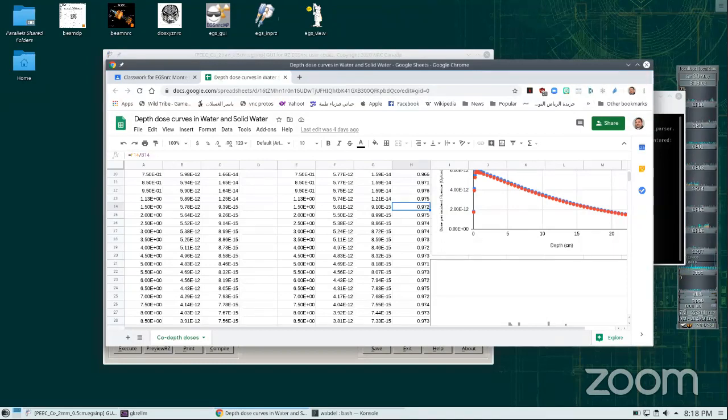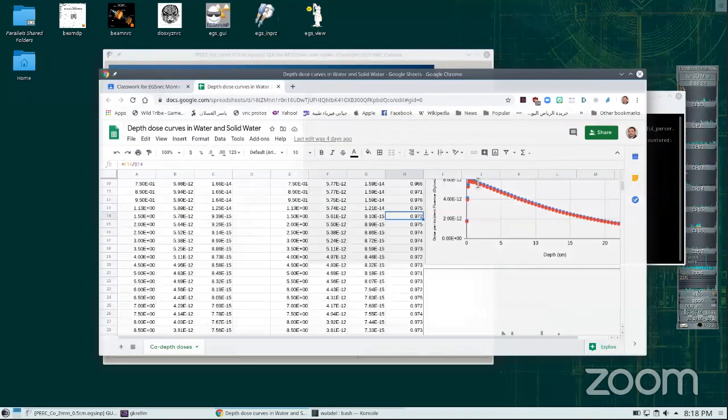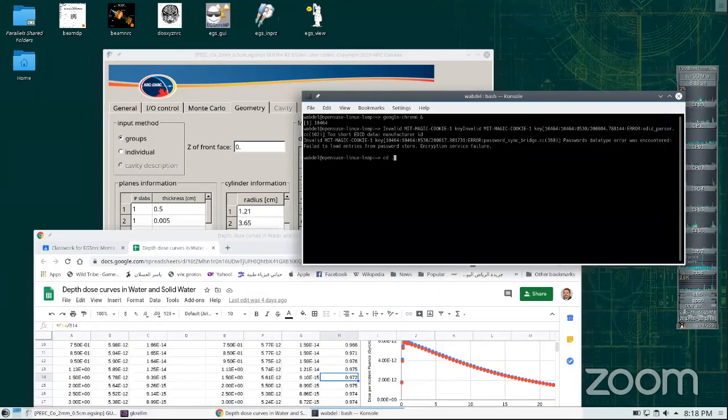Because I don't think in half an hour I can actually, although the concept is roughly the same, you cannot get the doses as simply as here, where you have this underscore DD file. With dose XYZ, you need a bit of work there, but you can get a few things that are interesting. Let me show you. Okay, so some people are asking just to give a brief introduction for the dose XYZ today, and next week you talk about it in detail.